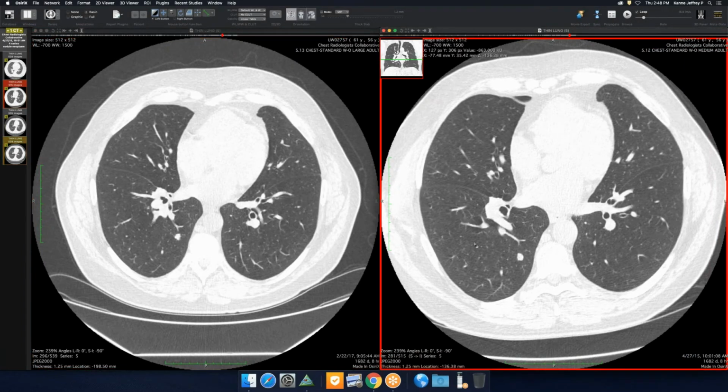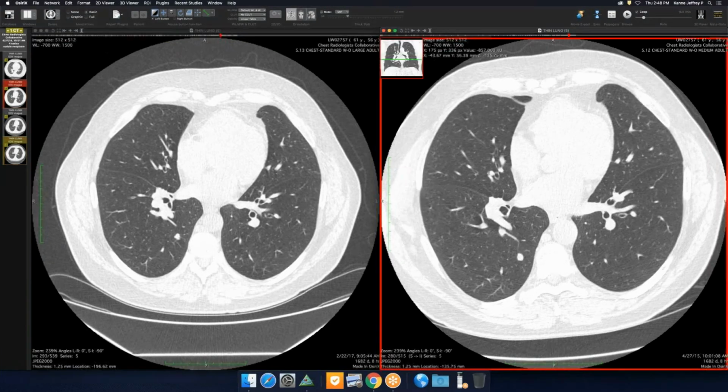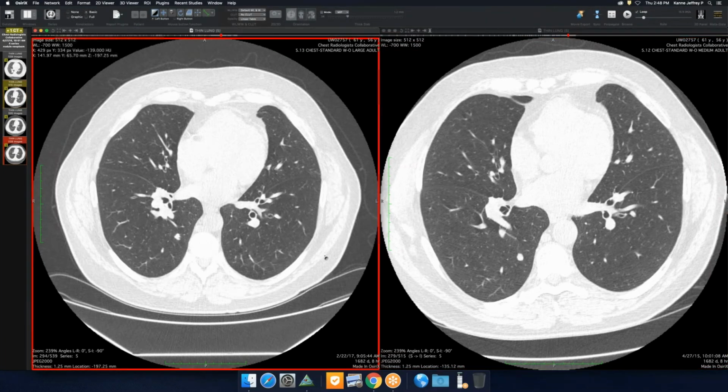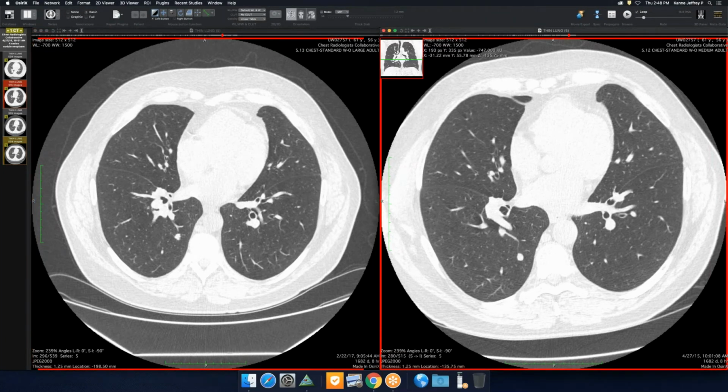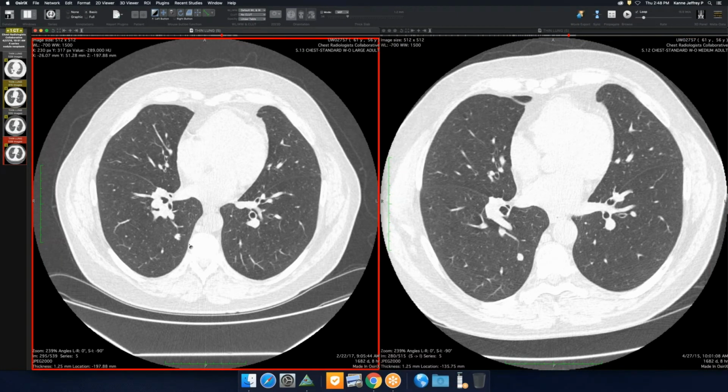And if you look at it, the shape has changed a little bit, but not a whole lot over 2 years. And actually, I went back and ran volumes on these. The volume is exactly the same within the standard error. It looks a little bigger, but not a huge amount of change. I'm sorry, I have these backwards. This was the original, and this was the follow-up. So if anything, it actually got a little smaller. But for 2 years, no big change. Now show up.